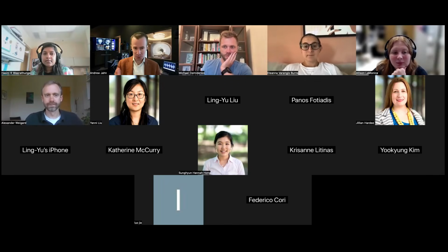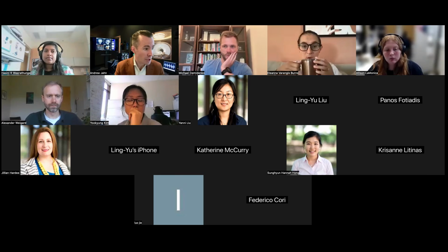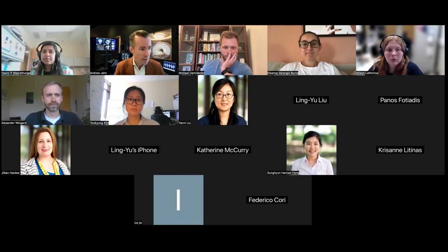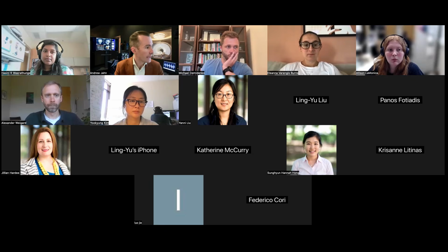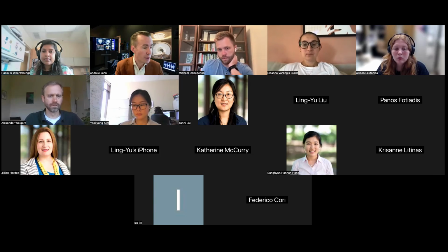Somebody who some of you may know, some of you might not, but this is Michael Demidenko, who is a University of Michigan Ph.D. graduate who spent the past few years as a postdoc in Russ Poldrack's lab at Stanford. And today he's going to be discussing how to use a pipeline he created that allows you to analyze task-based fMRI data sets from OpenNeuro while emphasizing transparency and reproducibility, specifically using something called Fitlins. So Michael, please take it away.